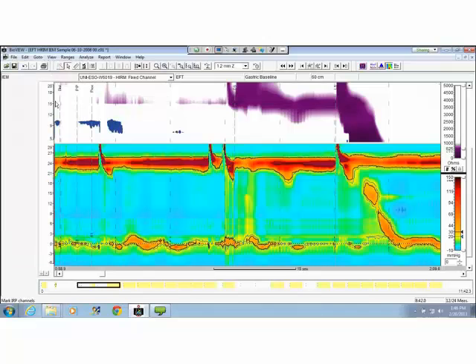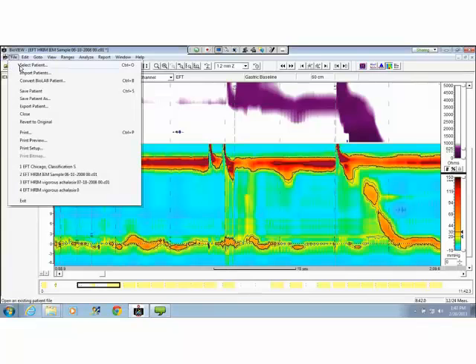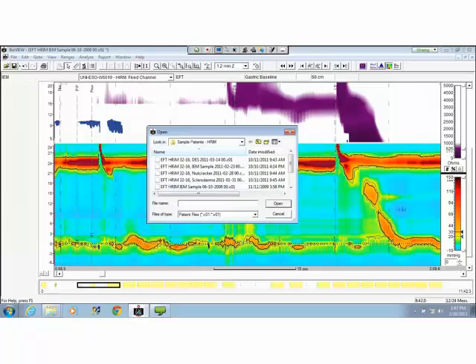Great questions. Any more questions people have come up with? Wendy? Yes. Hi, Tom. We see some, of course, with real huge nutcracker type contractions. I sometimes wonder how far to the right to follow that for the DCI, for example. Yeah, that's a great question. Because you can make a difference between 8,000 and not 8,000 depending on where you put the box. Yes, that's true.